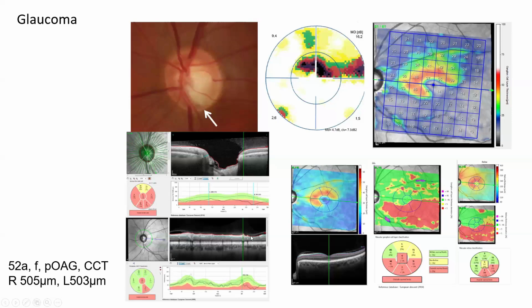In the B scan we are able to appreciate the thin nerve fiber layer, which is very important to look at because the B scan has a lot of information for us we will discuss later. And of course, we always have to check for segmentation errors before we trust this mathematical evaluation.